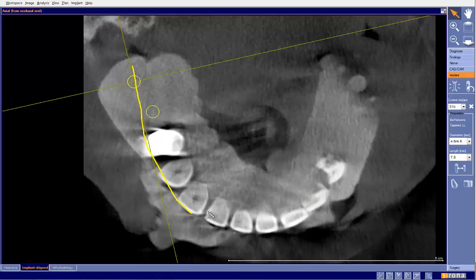Again, there's some guessing involved in this, but we're dentists, we can pretty accurately know that this arch is not going to suddenly go out that way, that this is where it's going to be. So when I look at this in this manner, the first thing I notice is that number 30 is definitely a little bit buccal, and 31 is quite a bit buccal. In fact, 31, if it's placed where it's planned, is probably non-restorable. Again, unless I'm way off here, which I don't think I am.